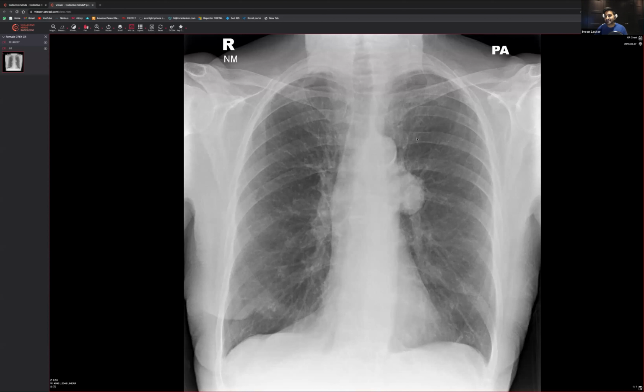Because at the moment, what we can see is what looks like a soft tissue density, loss of the AP window. Yeah, that's the AP window over there. I don't really feel like it's coming out of there. It feels like it's more lateral and quite far away from it. So what we can say 100% on this x-ray is there is an abnormal lesion located within the region of the left hilum. It's very well circumscribed.